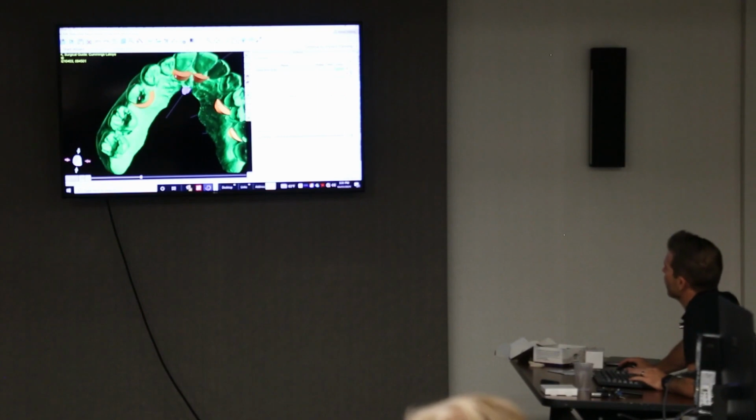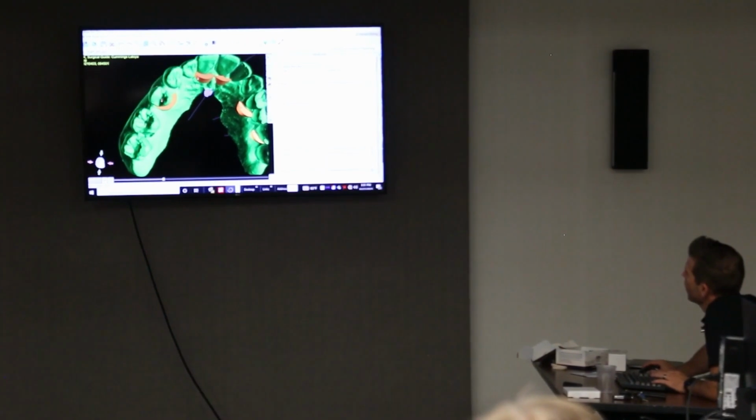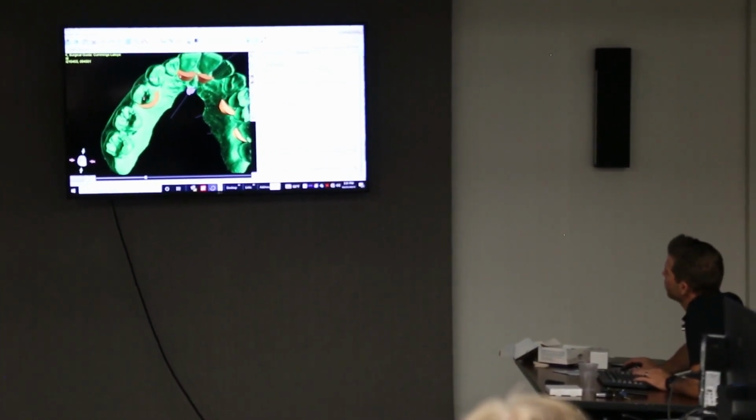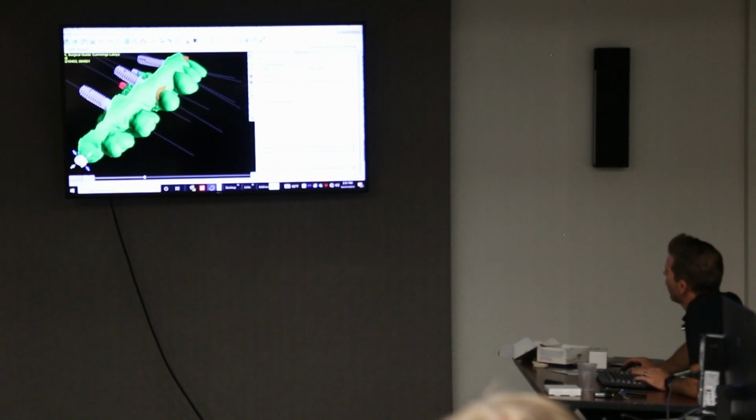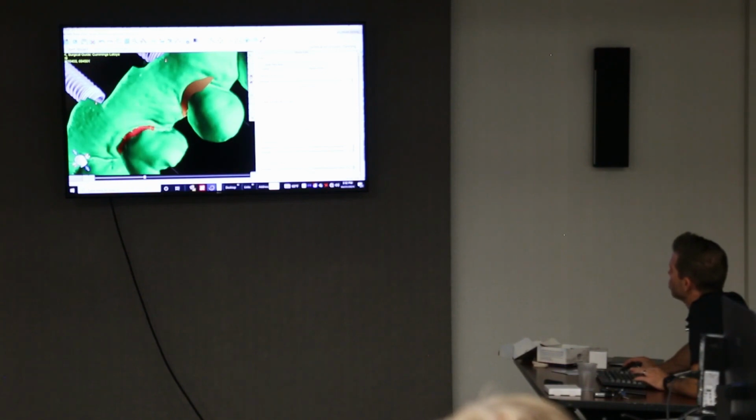And on the panels to the right, we're going to go to model edit. We're going to have the correct model selected. And then we're going to turn on my selection brush. You guys are fine just to watch this if you want. If you want to do it, go for it. I get a nice selection size here. I'm going to go around and select the whole base of the tooth here. So I'm holding shift.